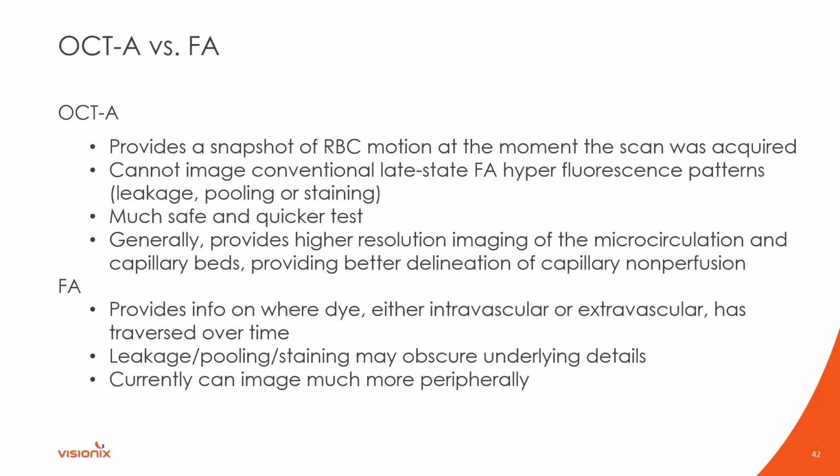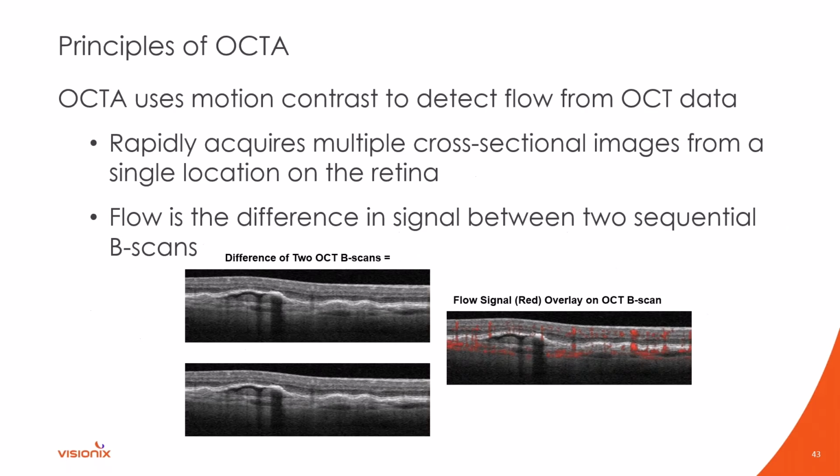Again, FA is still warranted. I want to make a clear message tonight that just because you have OCTA does not mean that you will never need a fluorescein angiogram. You may still need one. There are various advantages and disadvantages of both, but certainly OCTA has a prominent place.